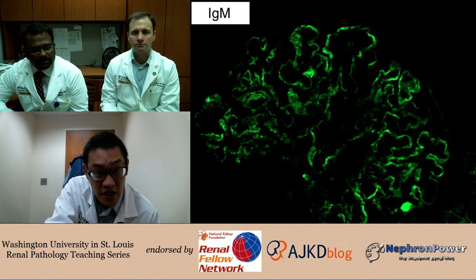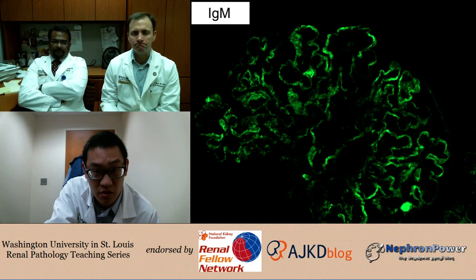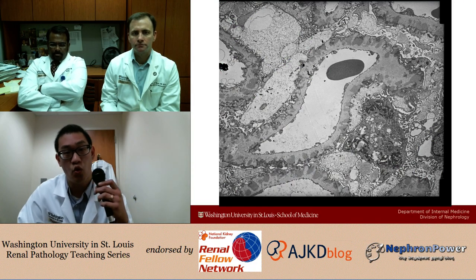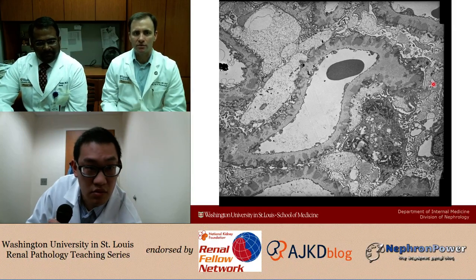IgM maybe slightly positive, but overall, if you compare the intensity, it's nothing like the IgG was. All right, and so I'm going to give you the EM, and you can tell me what you see and where you see something abnormal.